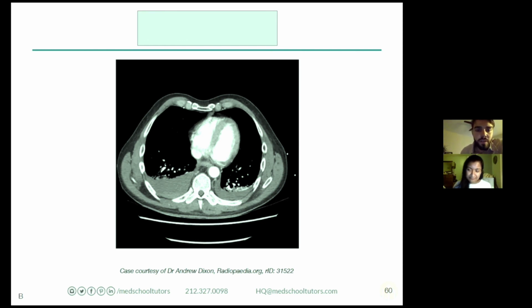Okay, so when I'm looking here, I want to look for things I know. I'm looking right here at the vertebral bodies. I'm looking at the lung fields. Do they look equal? Well, they don't look quite as equal as they normally do. There looks like there's some stuff back here. Additionally, it looks fluid dependent. We get those meniscal lines, like you get in a test tube, making me think there's some fluid back there. Because if it was air, it would create more of a straight line. And so that meniscus makes me think that there's fluid there.